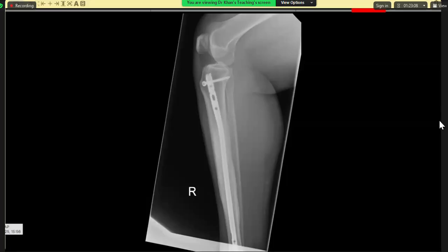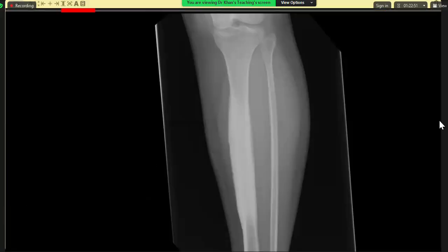These are the only ones available. What do you think is happening? Sir, I would like to compare them with any previous X-rays if available, and the history of the patient. Sir, I would like to advise a metabolic workup. Her age was 31, right? She is 31, yes. So a young patient with cortical thickening which is diffuse. Which area is thickened? Sir, the diaphysis is thickened.